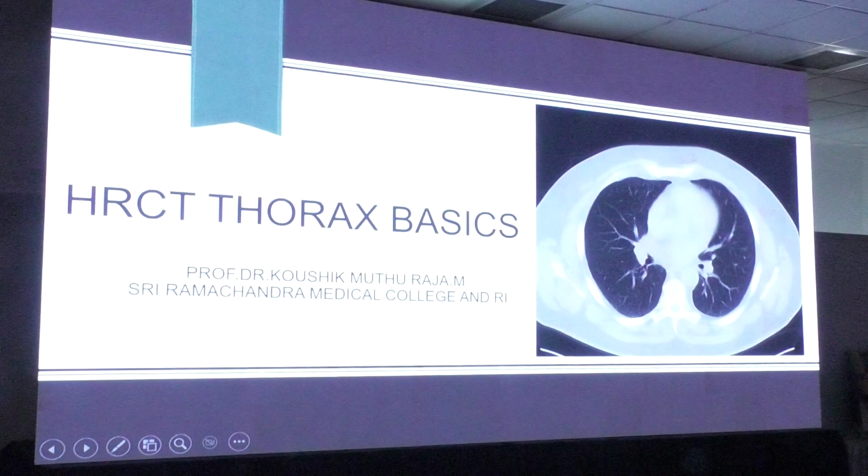I'll be talking about the basic patterns of HRCT, which everybody should know before interpreting a disease. So I might rush through the slides, but if there is any issue at the end of the session, you can let me know.